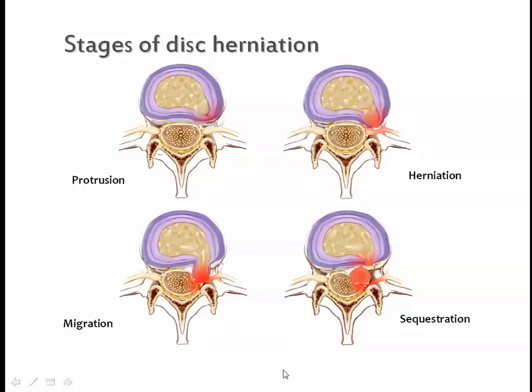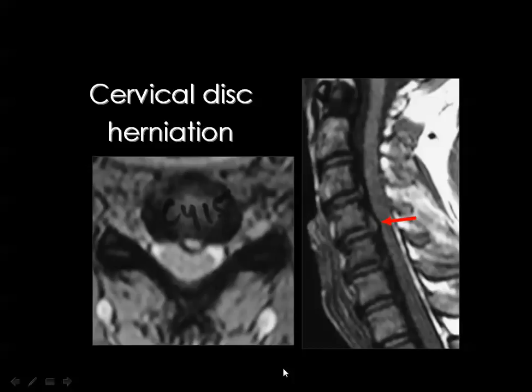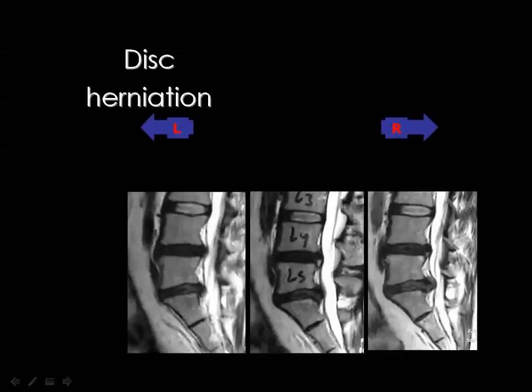Then, if you look here, this is the cervical disc at C4-5 level, and you can see the disc is extending inside the spinal canal and slightly going up. And this is central disc herniation with cephalic migration, let us say. Then you need the axial images in order to decide the direction of the disc, whether left or right. And you can also decide the direction of the disc, whether left or right, from the sagittal images, provided that you have the full series of the sagittal images.